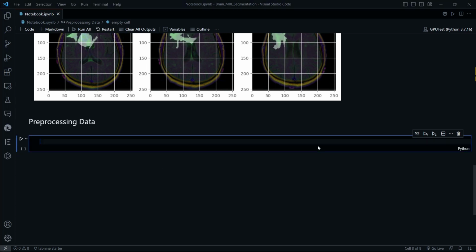Okay guys, hello and welcome back to the third part of this video tutorial on brain MRI segmentation. In this video we are going to pre-process our data and generate some of our code for the pre-processing. So let's dive into that.